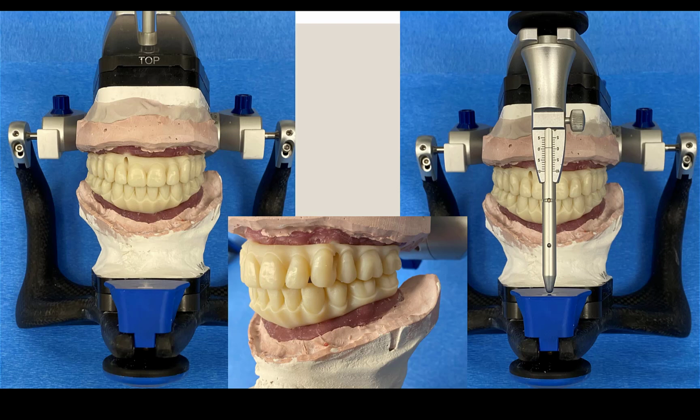Try-ins can be verified back on the articulator, and once approved, the design can be electronically sent, and Stoneglass technicians can begin the process of milling titanium substructures as well as milling the teeth, which can be made out of zirconia, lithium disilicate, or wear-resistant Heraeus prosthetic teeth for a more economically driven, lower-cost alternative.